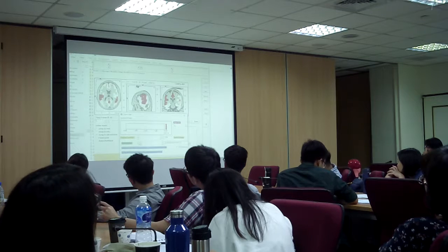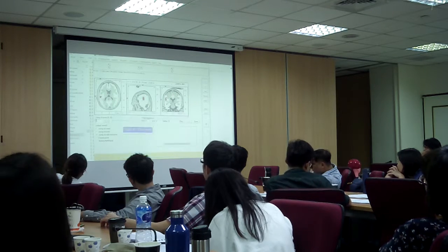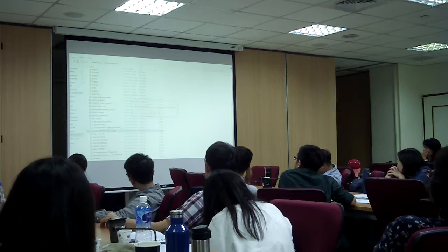All right, so I'm going to descale it, and I'm going to go to this, which is sLoreta. So it's another software.